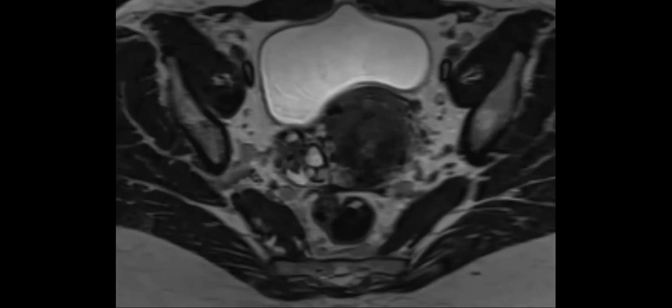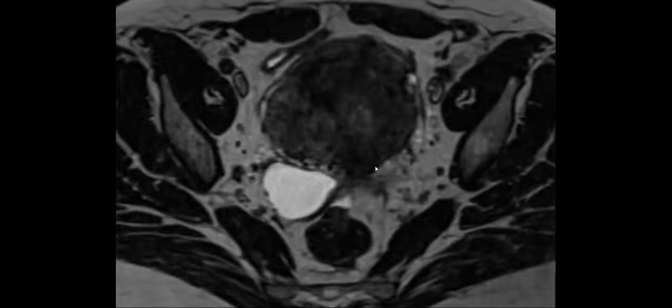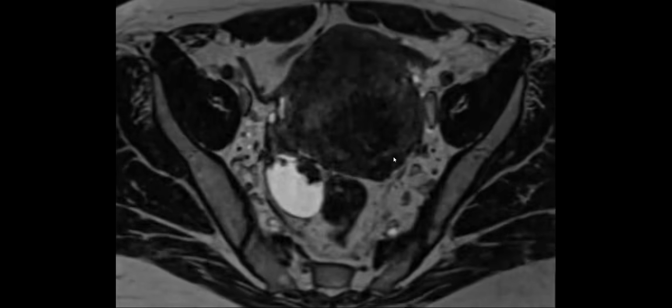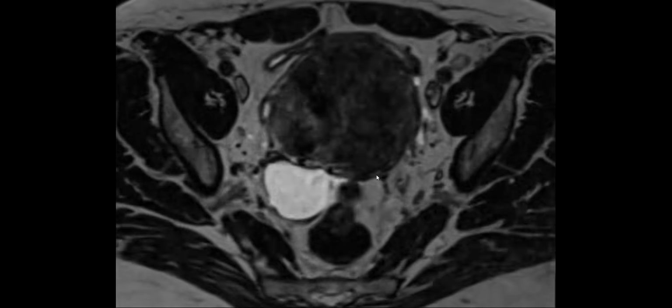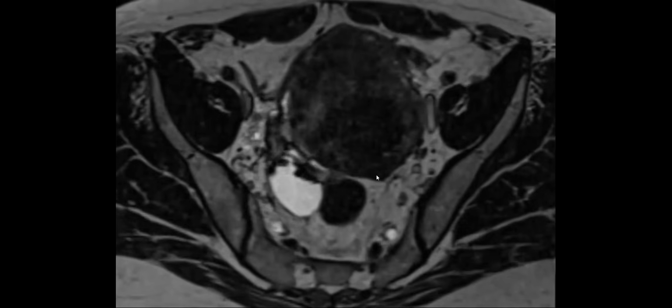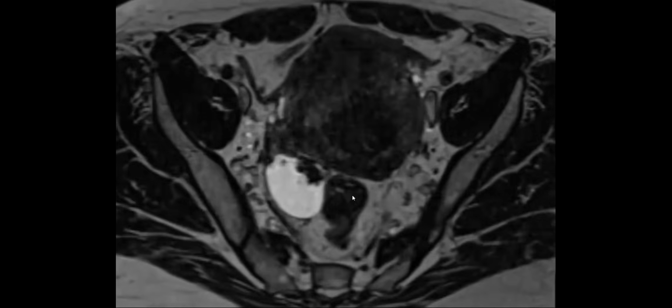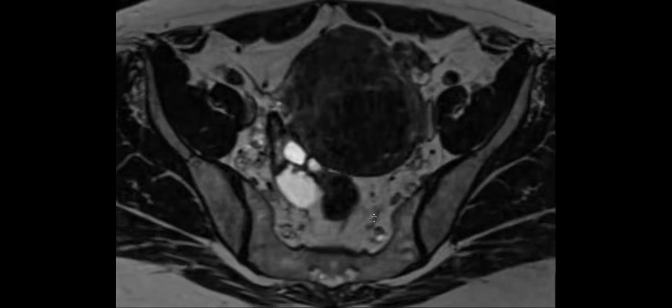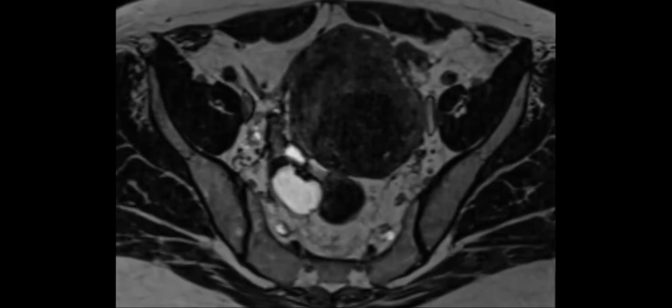Nelly, can you remind us of the 3 types? Yeah, I'm trying to pull it up right now. There's lesions that are more cystic, lesions that are more solid, and then something in between. Okay, but they're all considered benign, right? Correct. Yes, it's just an imaging pattern. There are 3 patterns of imaging characteristics on MR.